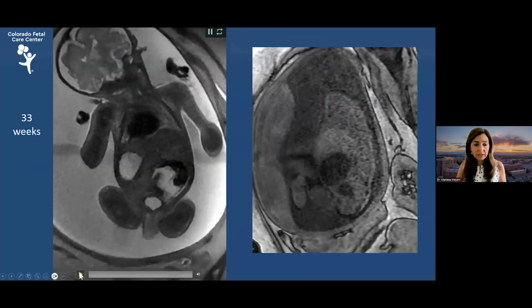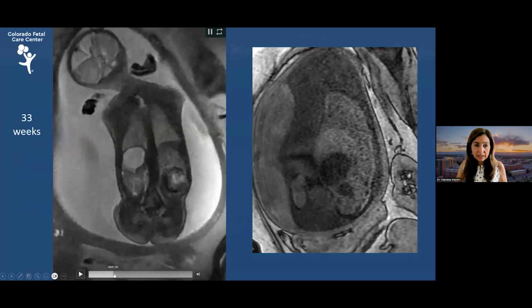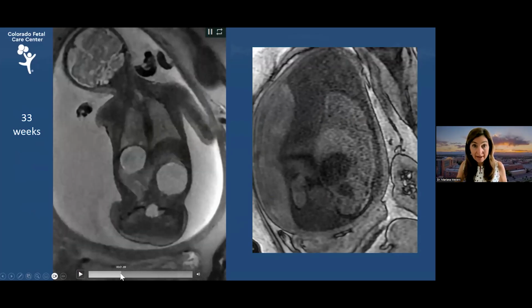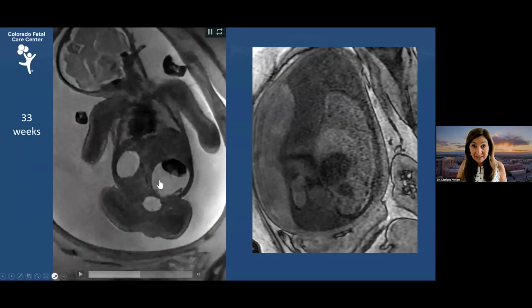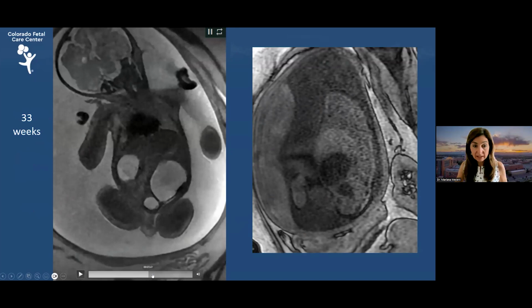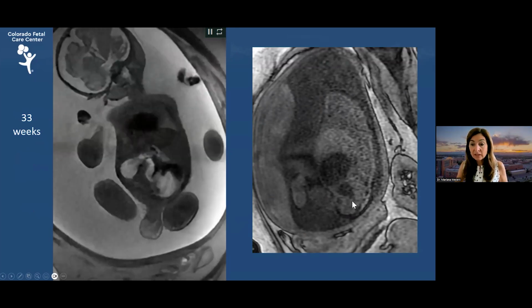And look at this comparison case. This is a case from far away. We do telemedicine in the state of Montana. And in these images, this fetus also has polyhydramnios. The stomach is very dilated, but the duodenum, actually, this is the duodenum, which is more distended than the stomach. So that was massive, very, very dilated. And the T1 images did not show any sort of bright meconium at the rectum or distal bowel. So you will see this variety. Depending on how tight the stricture is, you may or may not see it. And again, as you know, the meconium forms distally and goes progressively proximally.